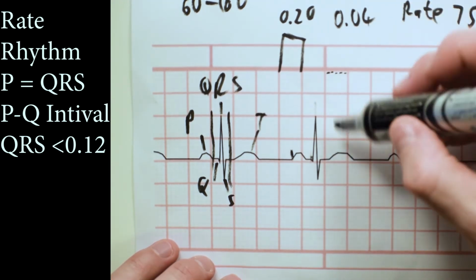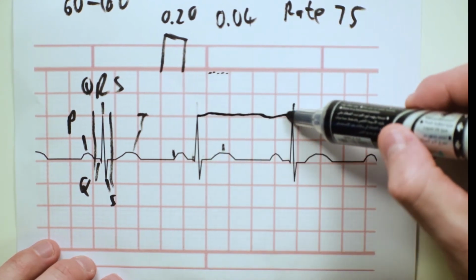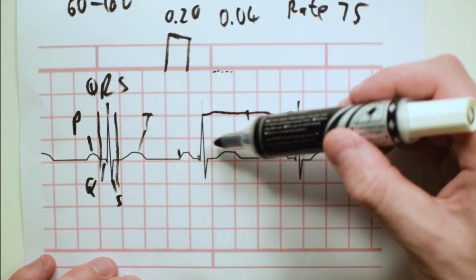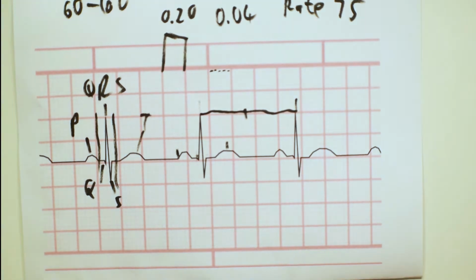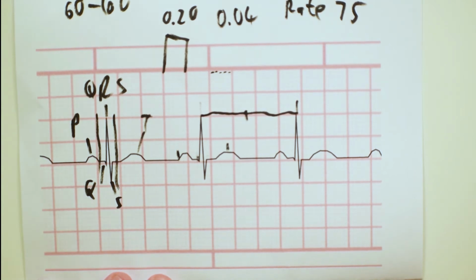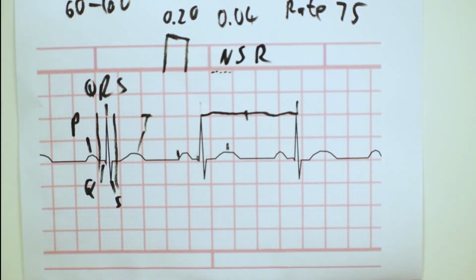And the center of the T wave mustn't be more than halfway between your R and R. So halfway between here, probably about there. So your T wave is normal. Your T wave is also not very big or spiked or anything like that, which can obviously mean other things, but here we have a normal size, normal shape, and that's really what we want. Because we have a P wave, it means that it is a sinus rhythm, because it's coming from the sinoatrial node. So this is called a normal sinus rhythm. Cool, so that is the first and most basic ECG.